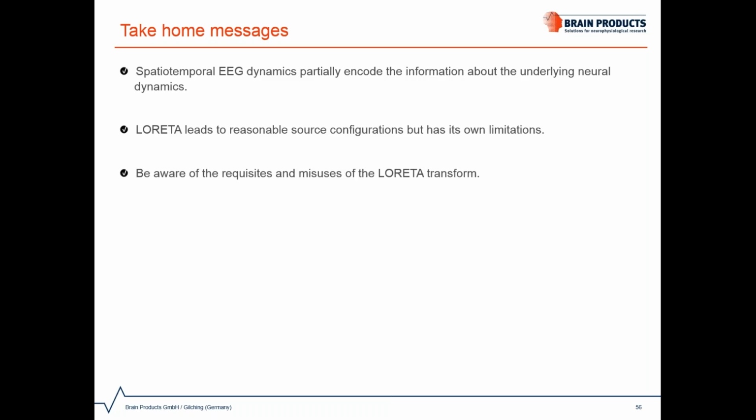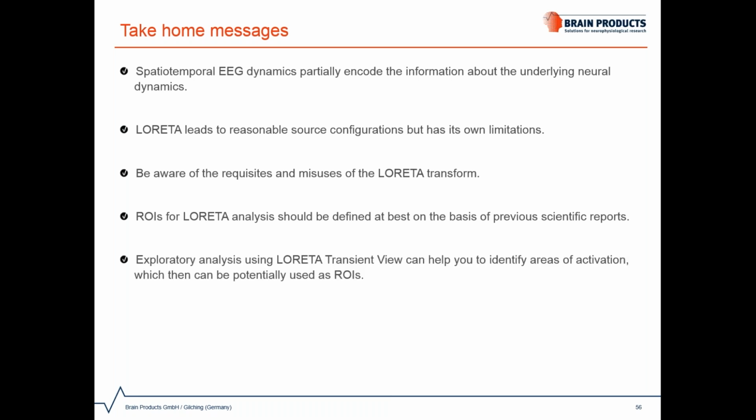Please be aware of the prerequisites and misuses of the LORETA transformation. Region of interest for LORETA analysis should preferably be defined based on previous scientific papers related to your research area. This can be incorporated together with the exploratory analysis using the LORETA transformation, either from the transient view or via the add-in option.